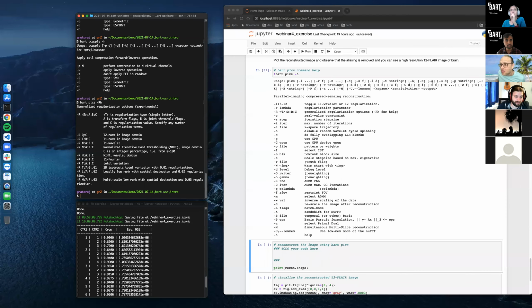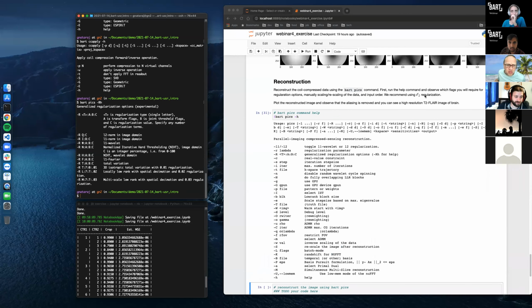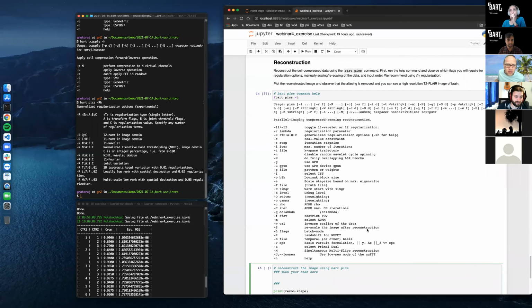What type of reconstruction are we instructed to do? Okay, we're doing L2 regularization. Nice and simple. We can change it later if we would like. So I guess I'll choose a rate. Wait for somebody to give me a number. Okay, that should be enough time.